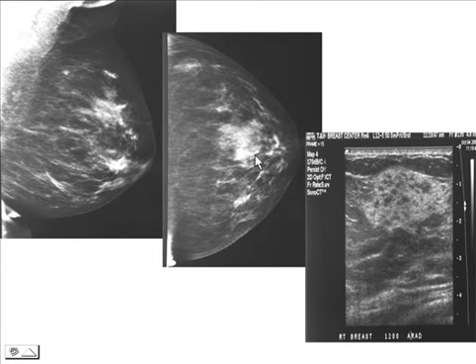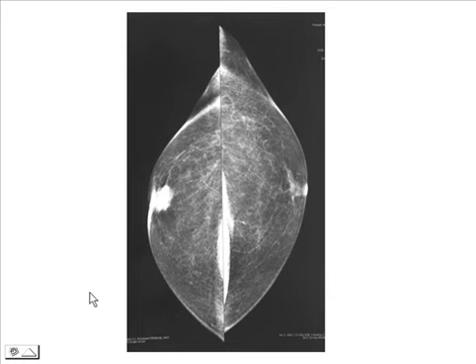This woman tells us that she's had previous mammograms at an outside institution. We're going to give it a few weeks, try to get those films. Sure enough, we did, and we could see that this area was perfectly stable for years and years. So it was the ultrasound that helped us not be so suspicious of this region and led us away from biopsy, so that ultrasound can lead you towards appropriate biopsy and lead you away from unnecessary biopsies.